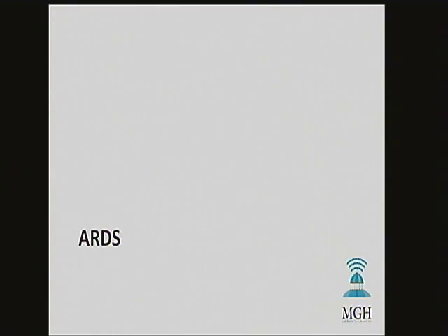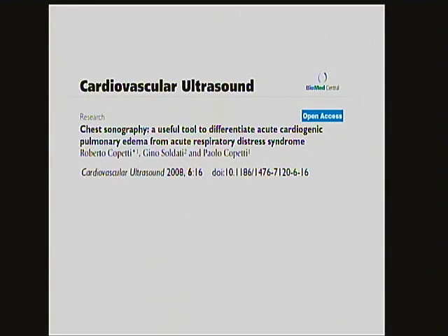And so I found that lung ultrasound is very helpful in this, because not only can it help manage the diagnosis, which I'll show you in a second how you make, it also helps you manage the vent strategies. So if you are having trouble ventilating someone and you increase the PEEP, you will see a change in your lung ultrasound within minutes that goes from a spectrum from consolidation to A lines. I'll show you a very cool study from France in a second. Okay, so first, how do you make the diagnosis?